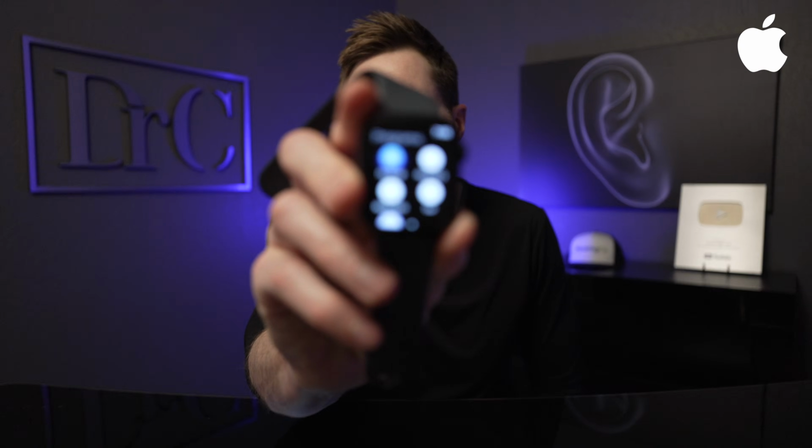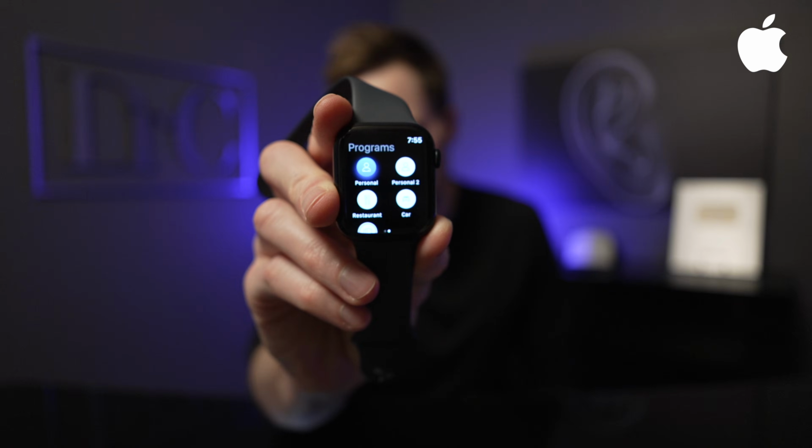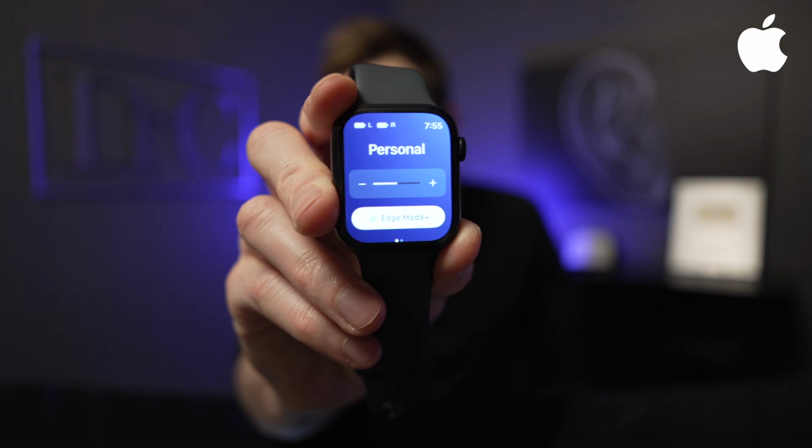So if I wanted to switch my programs, what I do is I need to swipe left, and you can see that I have these different programs available to me if I wanted to switch into any of them. I'm gonna go ahead and just leave it inside of the personal program here, and I'm gonna swipe back over to the home screen there where you can see it says personal.